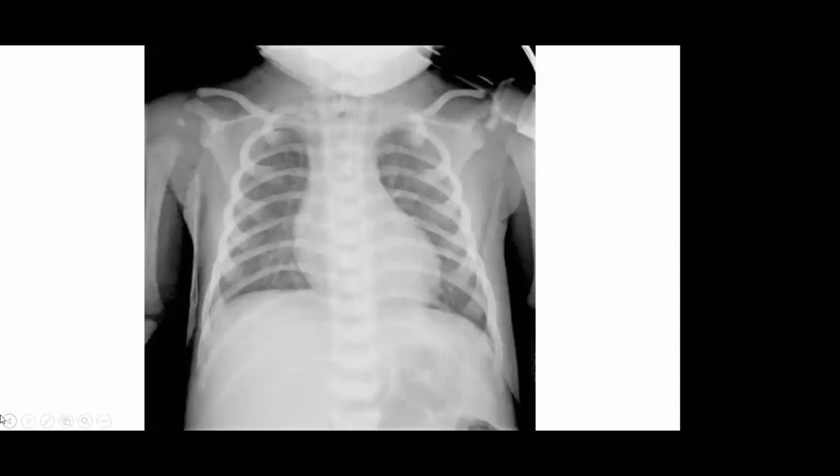Looks like, so more or less this is a normal chest X-ray of a newborn baby. Okay, so the ribs are there. You won't see the anterior end of the rib because they are not yet ossified. This baby will be intubated, so you can see the endotracheal tube here. Okay, so this is how an overall X-ray looks like.